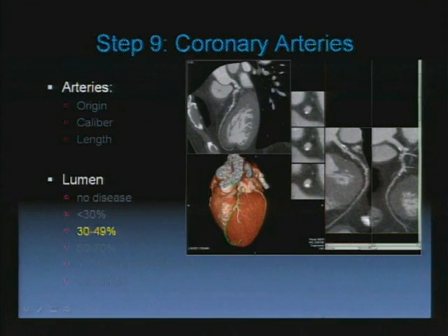And then the next category we have is 30 to 49%. And here you have a patient who's got some calcified plaque, a little bit of soft plaque, also non-calcified plaque, I should say.